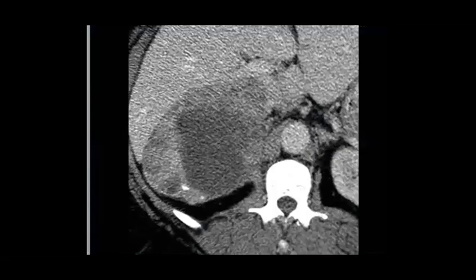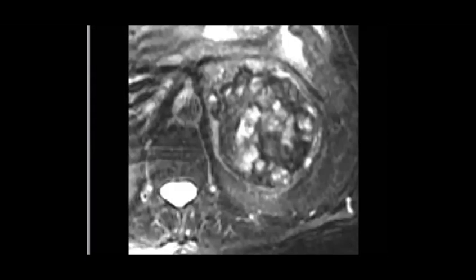Primary tumor, like what? Primary cancer, like what? You can find this large lesion. When you find a large lesion in the adrenal, either it is pheochromocytoma, but when it is bigger and there is invasion, and you can see some invasion of the IVC, then you are talking about adrenal cortical carcinoma.